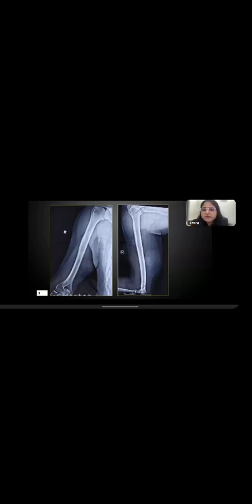Okay, go on. I have got diaphyseal lesion, myositis ossificans. Okay, I can see that people are writing soft tissue lesion. So that is one thing that is giving me happiness because what you can see is the bone or the humerus that is shown here in 2 views is relatively normal. The lesion that is there is in the soft tissues or in the medial aspect of the arm, and it has large calcification or macroscopic calcifications within.